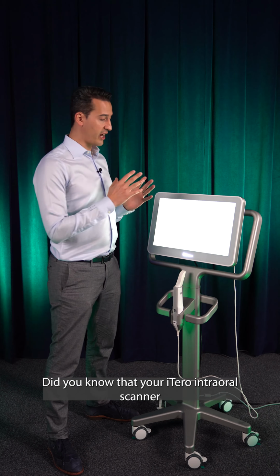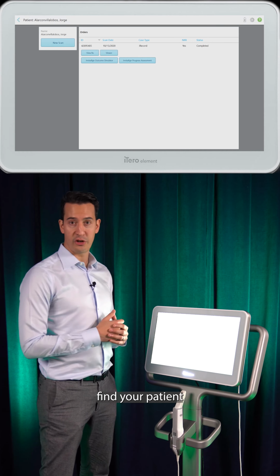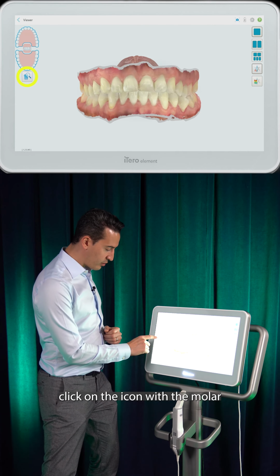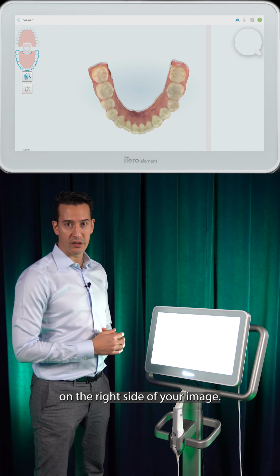Do you know that your iTero intraoral scanner is also an intraoral camera? Let me show you how to take advantage of this. So first, find your patient and click in the viewer option. Click in the icon with the molar and the magnifying glass, and a new option is going to appear on the right side of your image.